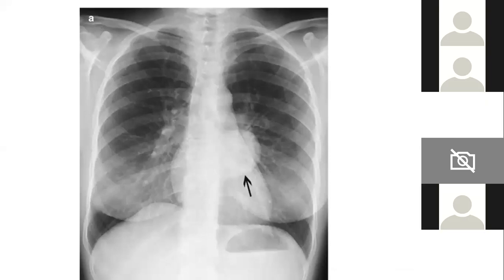Yeah, what about this? Why posterior? No, don't go to the diagnosis. Just try to describe the location. It's a mediastinal mass, I'm telling you.